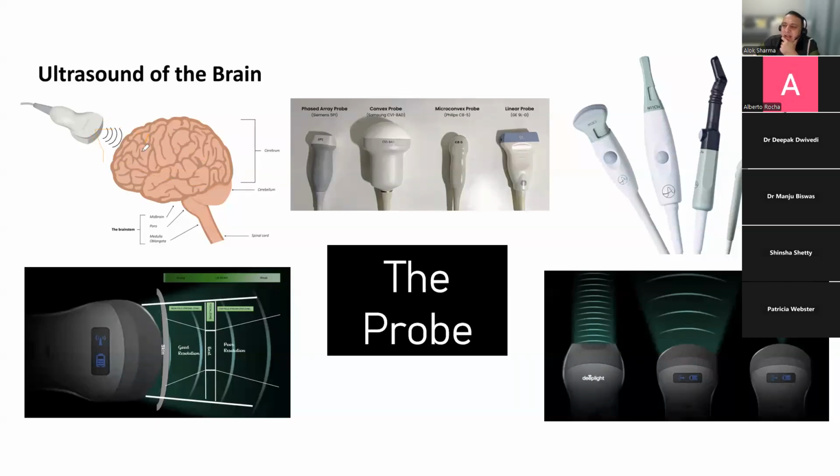Now, waves interacting with the most superficial areas with a higher frequency will come back more quickly. So actually, from our perspective, not only will you have better resolution, but the images over here will appear brighter. On the other hand, ultrasound waves have had to pass through tissue to get to the back of the brain. More tissue interaction, more absorption, more attenuation. So what's reflected back is weaker. And actually, the brightness of the image at the back of the brain is going to be much poorer.